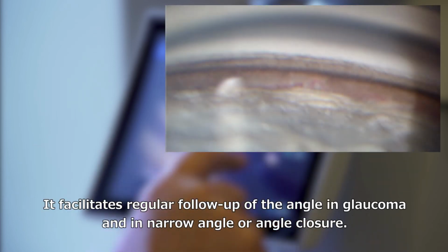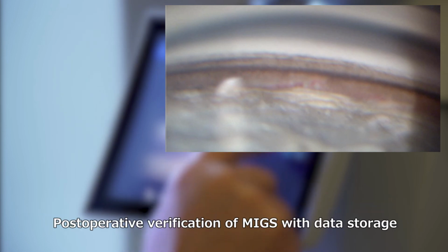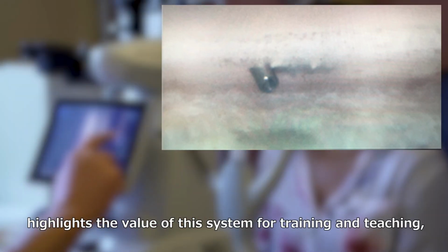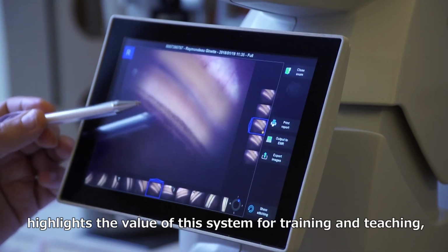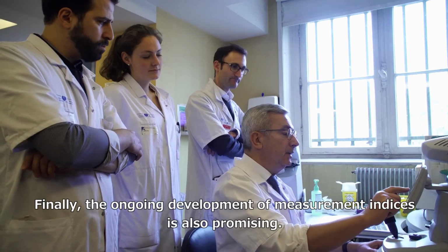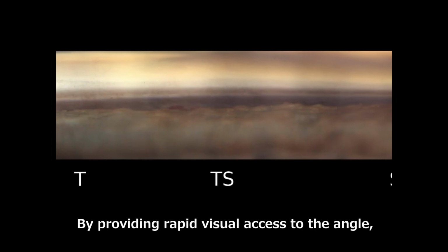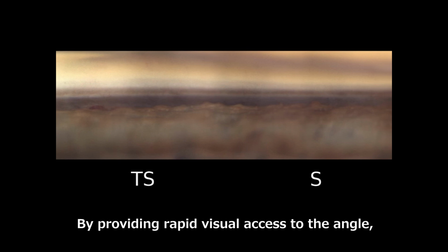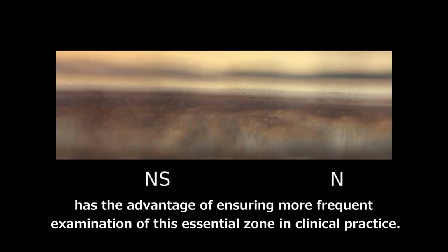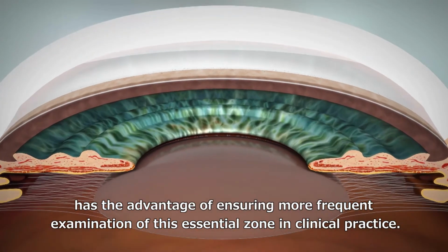It facilitates regular follow-up of the angle in glaucoma and in narrow angle or angle closure. Post-operative verification of MIGS with data storage highlights the value of this system for training and teaching, as well as its potential medico-legal value. Finally, the ongoing development of measurement indices is also promising. By providing rapid visual access to the angle, automated gonioscopy, even limited by the absence of dynamic examination, has the advantage of ensuring more frequent examination of this essential zone in clinical practice.